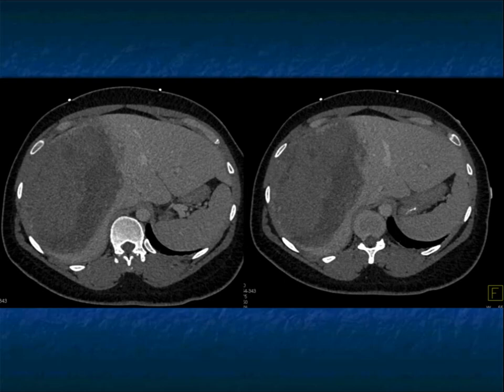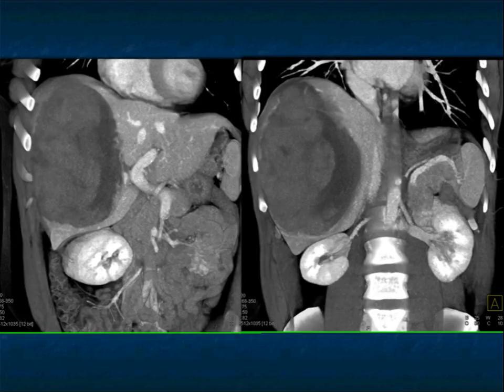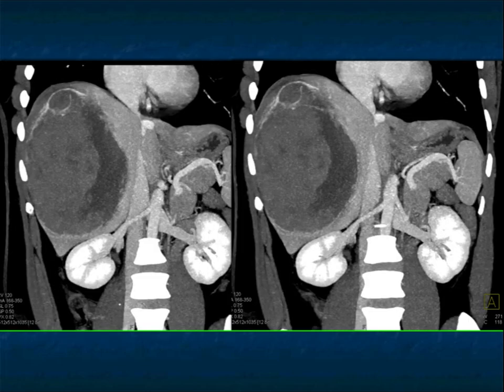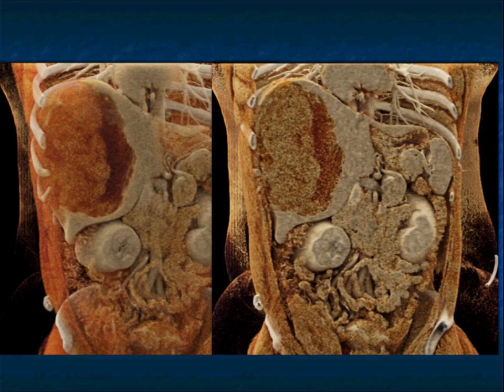This is a good example of what looks to me like a hepatoma that bled. Large solitary mass, big liver, stretching of the vessels around the mass itself. Now, hepatomas, 85% are hypervascular, but not always. So perhaps I'm dealing with a hepatoma that bled. But again, resection, this was hepatic adenoma, stretching of the vessels, large bleed present, nicely seen on the cinematic rendering.